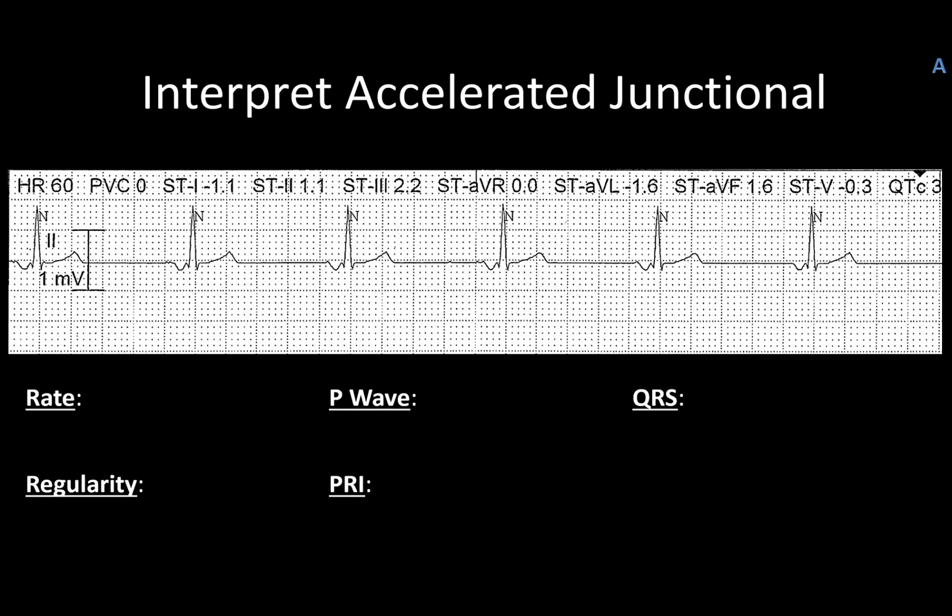All right, on to the next. We'll do our usual. And we are 6 total beats. And we can actually count between these as well because we are very regular. We have no pattern.